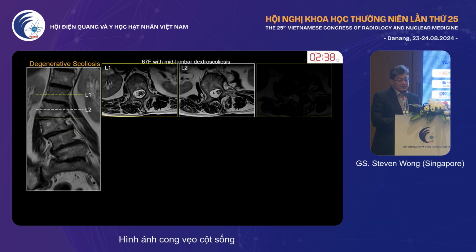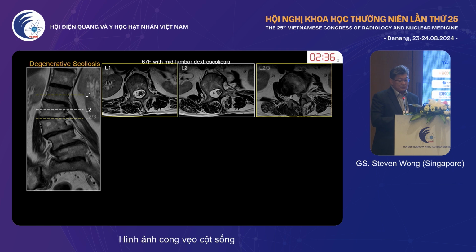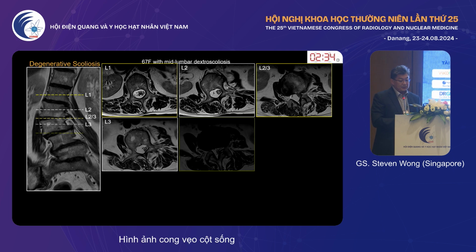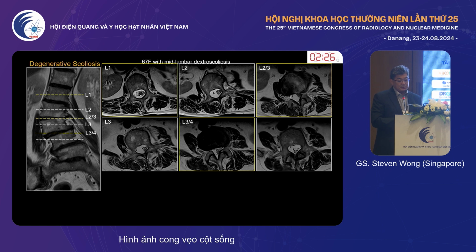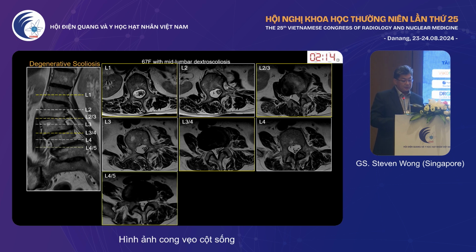For this, you can just illustrate the change in the position of the neural exit canals relative to the cauda equina within the central spinal canal and the tilt of the patient. Sometimes you may have to tell your techs to do an oblique axial just to show the proper dimensions within the spinal canal.